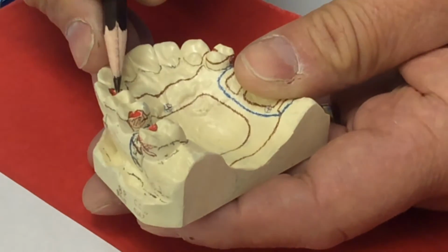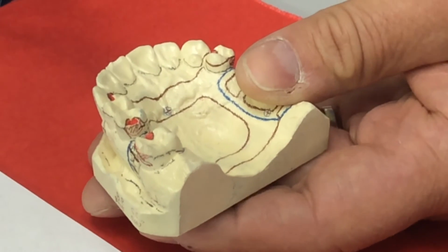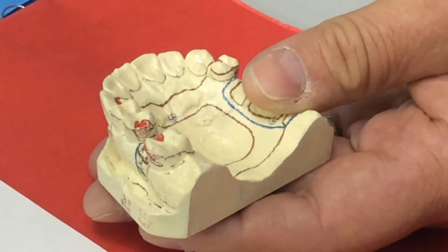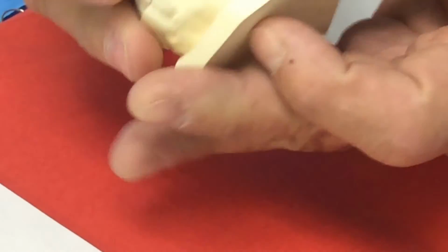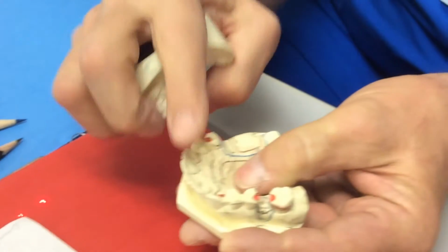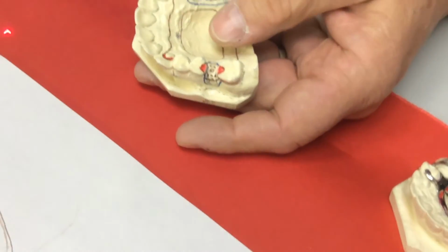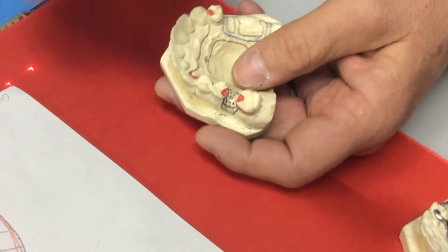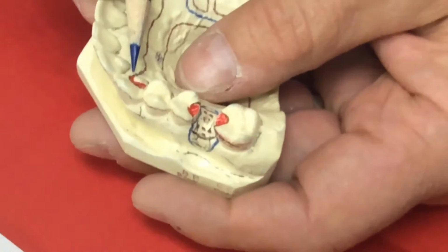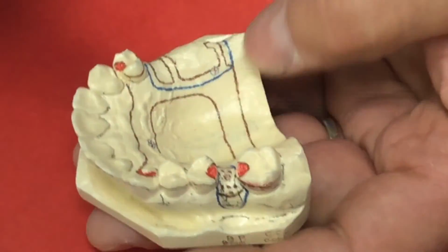We don't loop over it in general like this is drawn here, except in the maxilla. And the reason we do it in the maxilla is because there's an opposing occlusion that's going to fit in here, and when those two teeth come together, if you have taken that metal plate all the way up close to the incisal edge, there's not going to be enough clearance and you're going to have to grind it off. And so it's kind of okay to loop it around like this when you're dealing with the maxilla so that it doesn't interfere with the occlusion.